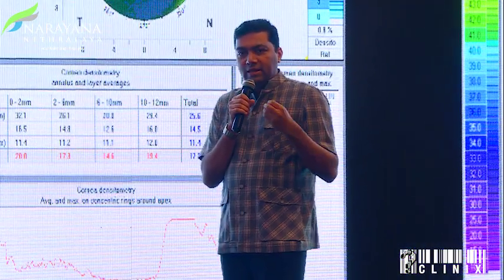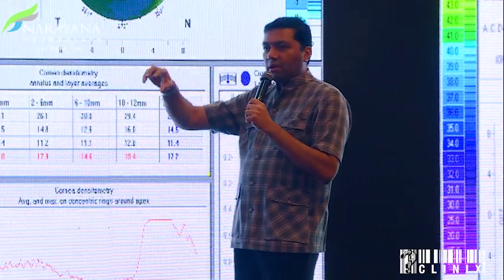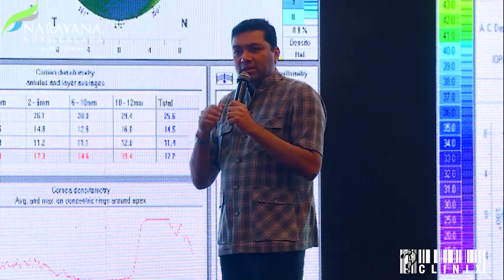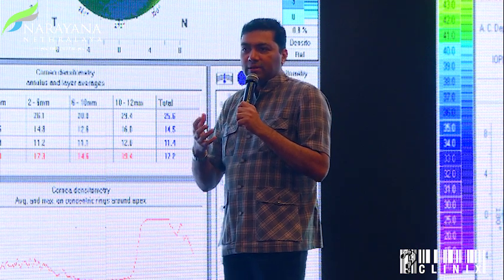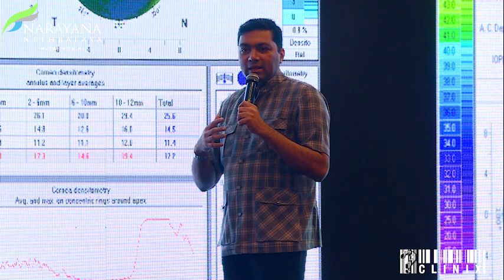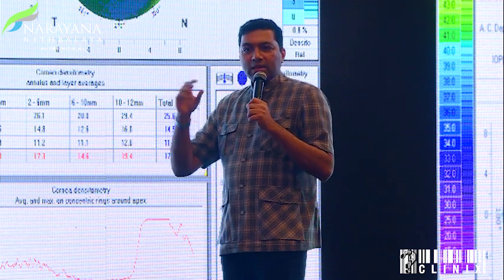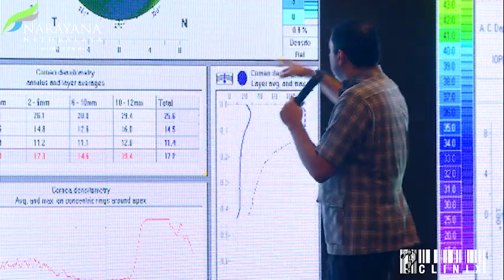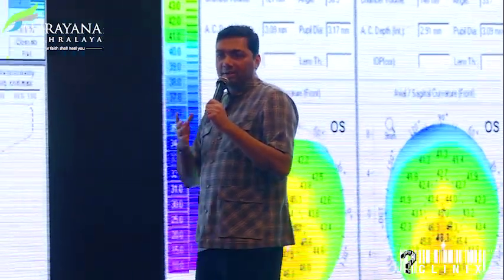The initial AI is not picking up any of these values, it's picking up virtually everything. The most interesting part is what the AI is picking up. You can believe or not believe in AI, but it's not what we have been studying. It's picking up things on the Pentacam, those values here, which we have never ever looked at.